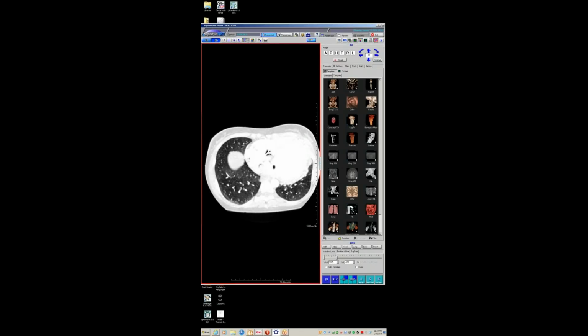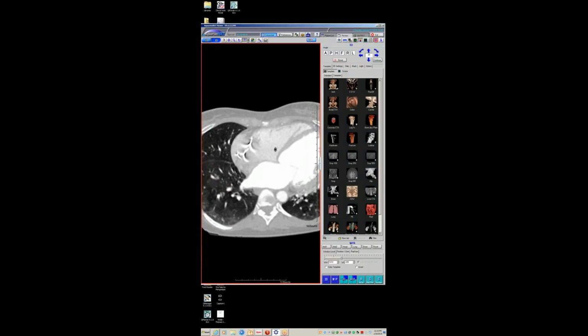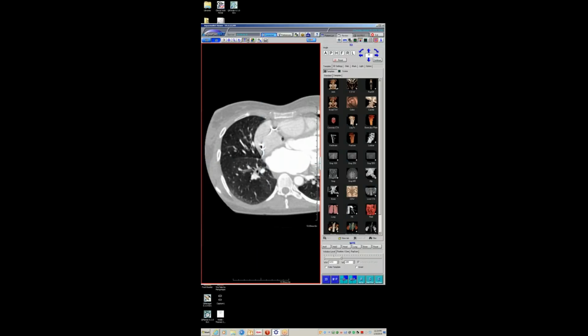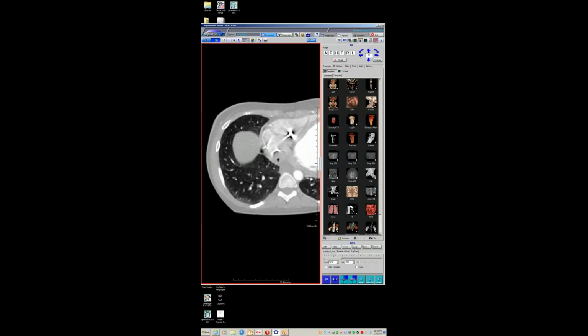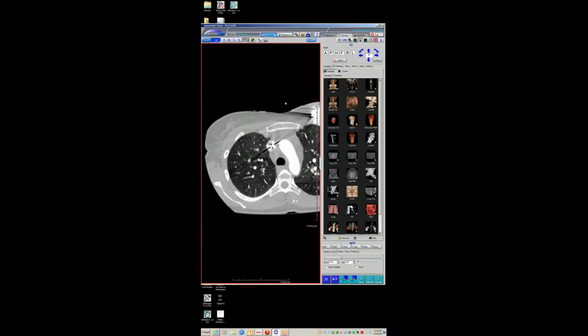And the lungs are not normal as well. The airways are very abnormal. I wonder how much of this is vascular related. I would assume most of it's airway related, the mosaicism, given the severity of the airway injury in the areas where it's more hypoattenuated. But anyways, those are kind of a quick shoot through my cases I've had the last week or so. All right. Thank you.